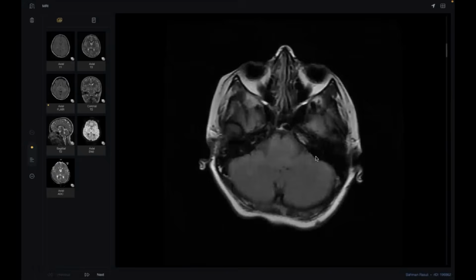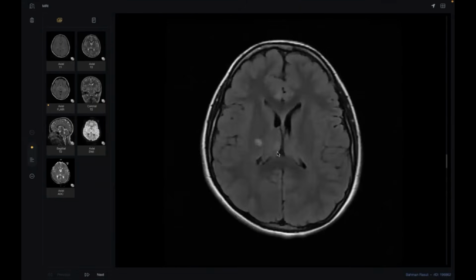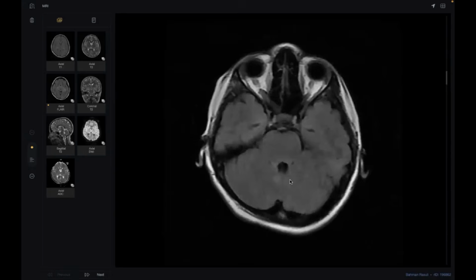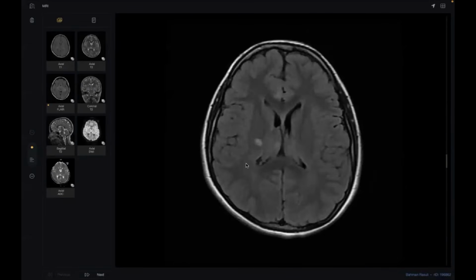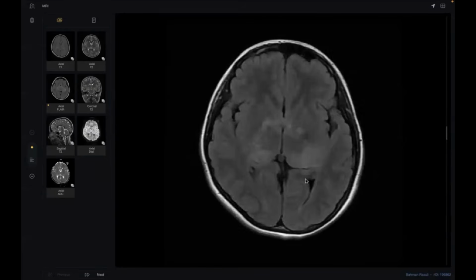My advice for all of you, when you are stuck in a diagnosis for something like this, look at the orbit, especially the orbit, to rule out NF1, and look at the greater wing of the sphenoid, or any other masses, or any subcortical abnormalities, or subependymal calcification to rule out tuberous sclerosis. So the golden advice of today, when you have something vague like this, don't speak much about it.